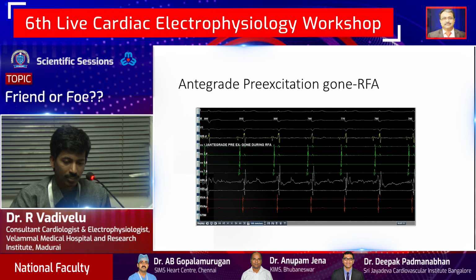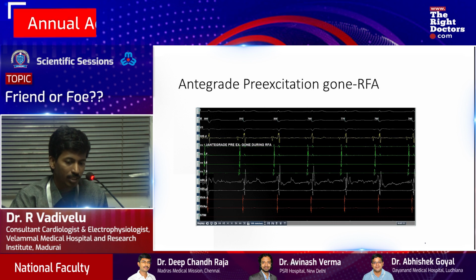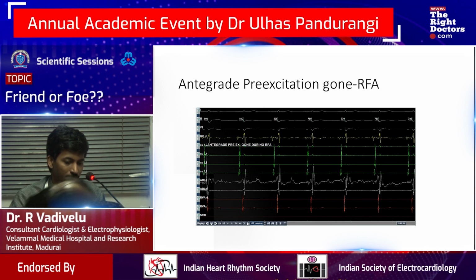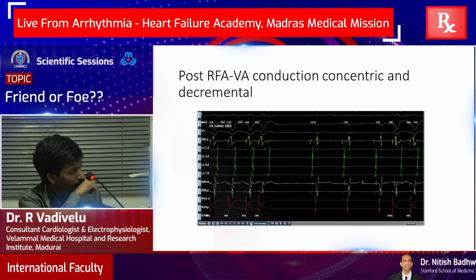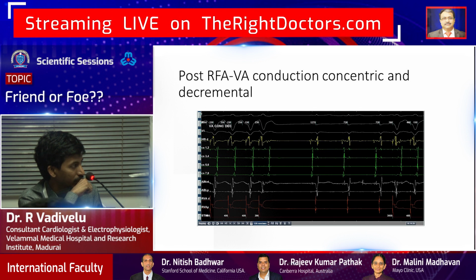This is the atrial pacing maneuver. During atrial pacing, as it becomes maximal pre-excitation, the His moves towards the V. But this potential is not moving with it. If it were a His, it would have moved, and the gap should have become less. If it is an accessory pathway potential, then it will stay away from the His. Or we can give an atrial extra stimulus also to differentiate. So atrial extra stimulus will also separate them.